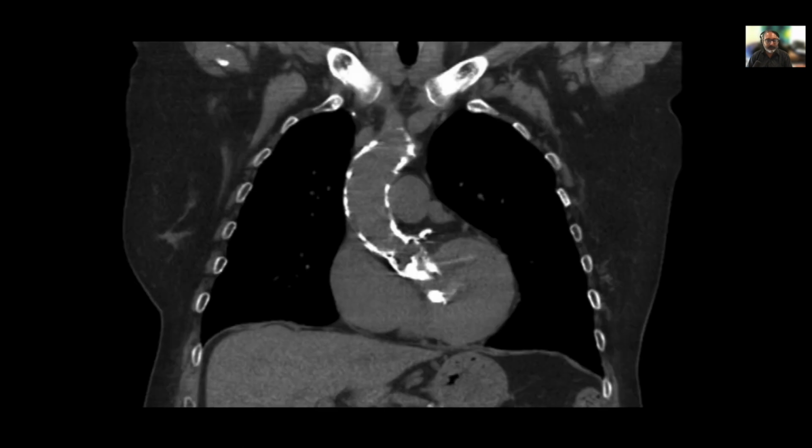Okay. What is this? So what I'll tell you is this calcification in this structure here, but I will ask you to tell me what that structure is. Yeah, so coming off the left ventricle, I would say it looks like there's actually some in the aortic valve, but up with the ascending aorta.